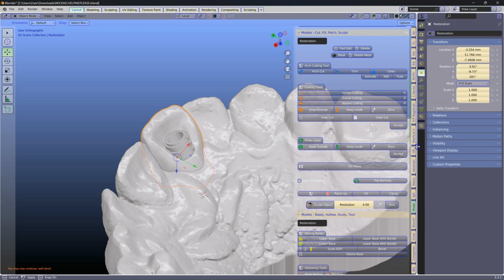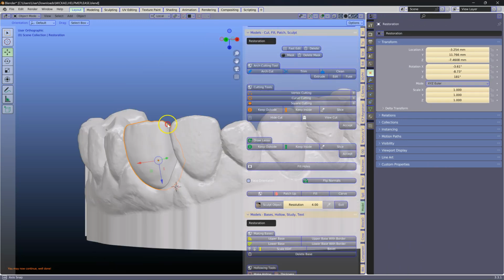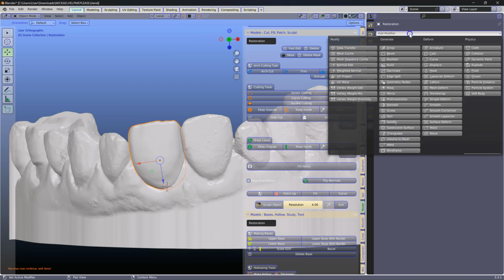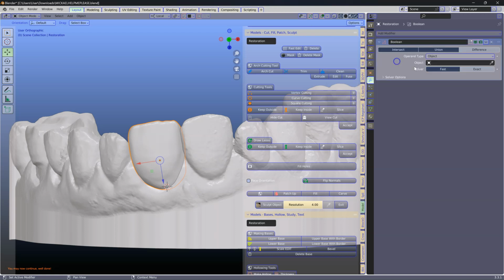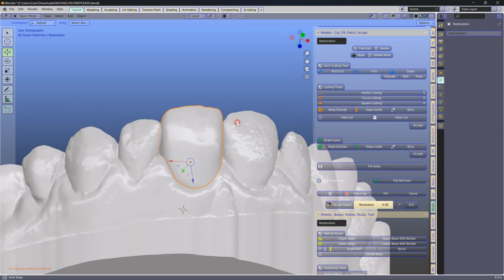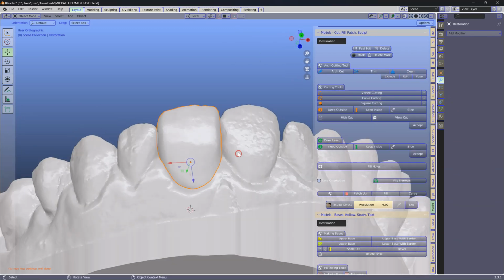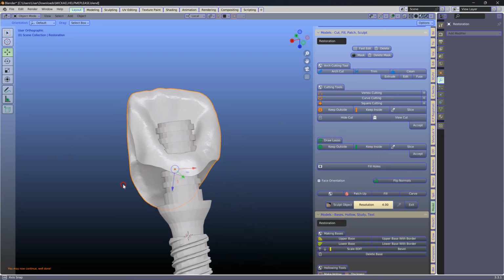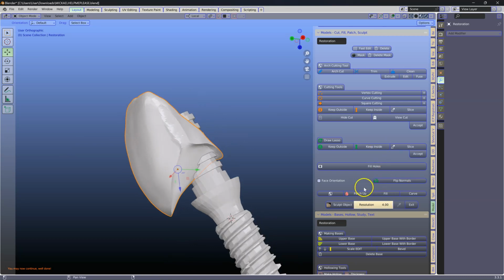I'm not going to use the modules because I just want to do a straight Boolean cut. So to do that, spanner, go to Boolean, click on fast, use this one and drop it there, which has then cut it off perfectly, and apply that. That's really good. And I've done that so that it has no different vertex groups, and it sort of remains unaffected by using the modules.